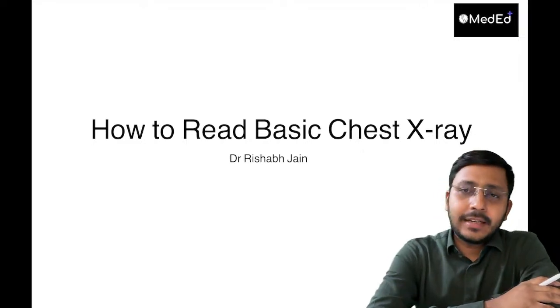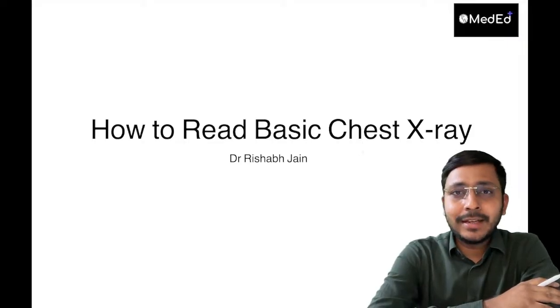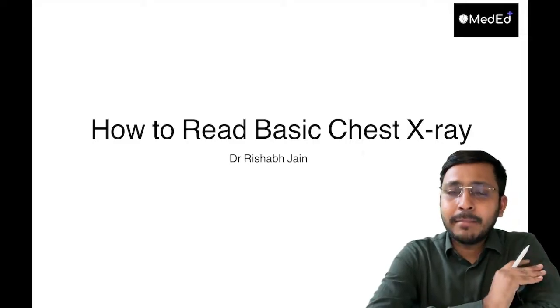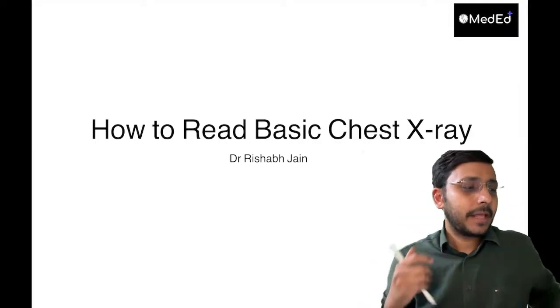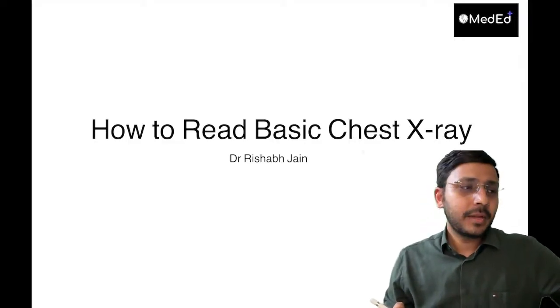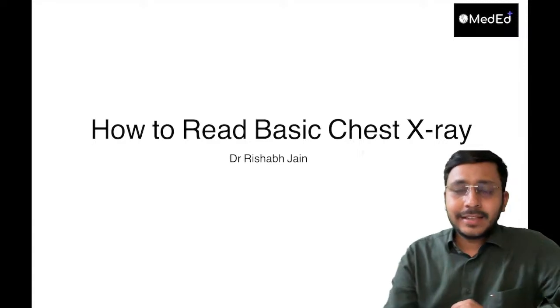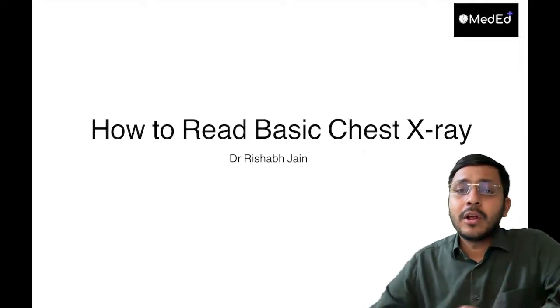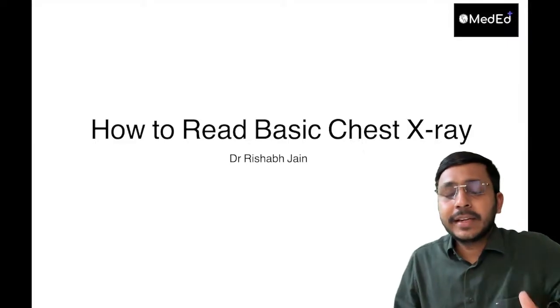Good evening. So today's class is going to be a clinical masterclass, and what other clinical masterclass do you need than how to read a chest X-ray, right? Because chest X-ray is the basic investigation that you as an MBBS student need to know and have to know, right? Because you will be posted independently in PHCs during your internship, and you will be working as a medical officer after your internship. So you need to know how to read a chest X-ray, right? In today's class, we'll touch upon the basics of how to read a chest X-ray. In subsequent classes, we can take an advanced class on the various pathologies. Some pathologies I'll cover in today's class also, but a detailed class we can have another time.